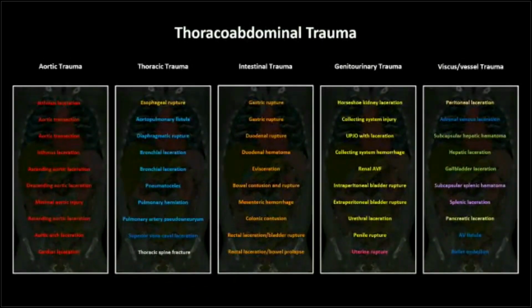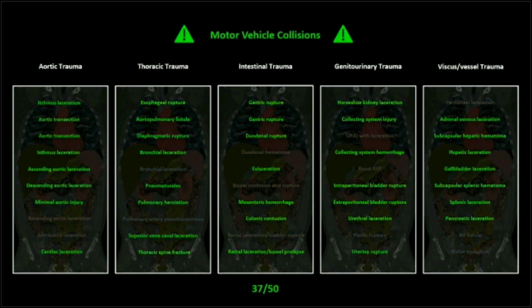All right, I have broken things down into 5 basic organ segments. I know there are a lot of them. I told you, 3 years I've been working on this. But I also put some icons in so that you can see some basic facts about every case.